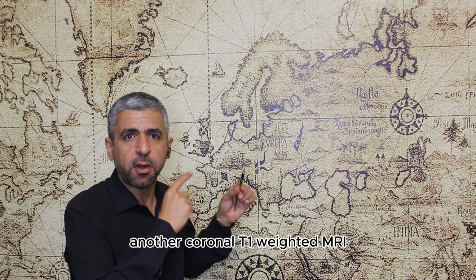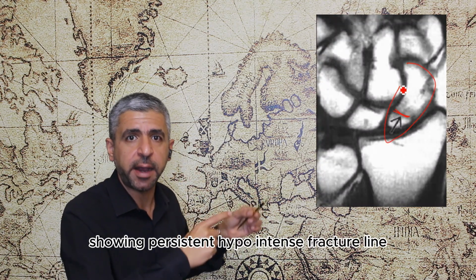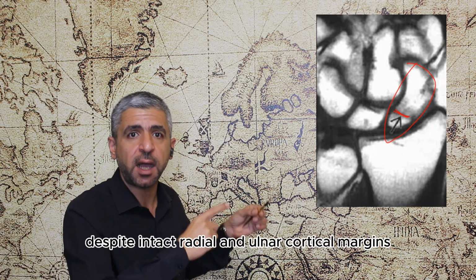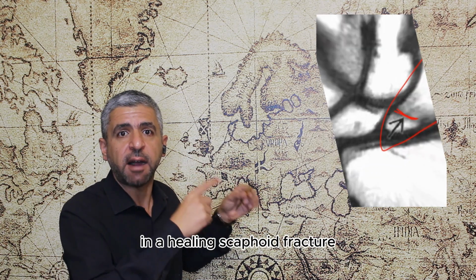scapholunate ligament. Another coronal T1 weighted MRI showing a persistent hypointense fracture line across the proximal pole of the scaphoid despite intact radial and ulnar cortical margins in a healing scaphoid fracture.